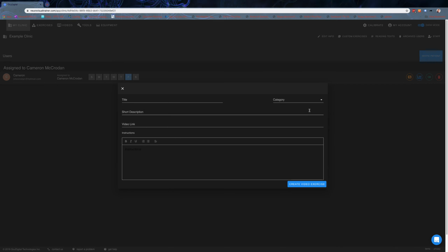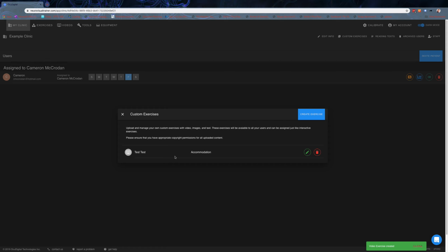And when you click create, it'll create that exercise. So if we come back through here, we click create, and we put in that one title is called test, give it a category and create the video exercise. It'll actually run through and put it into that category, which we can then get rid of.